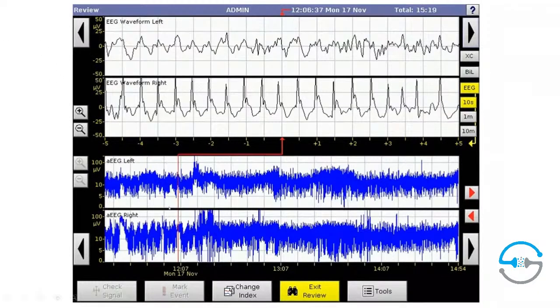So here's another example. These are a little bit less clear when we're looking at the aEEG, but this is repetitive seizures. So happening for, this is about 5 minutes, 15, 25, 35, 45, 55. So for almost an hour, right up in here, we're seeing these intermittent uprisings. And here's one, and here's one, and here's one. So we have these intermittent uprisings, which become very clear to see as time evolves.